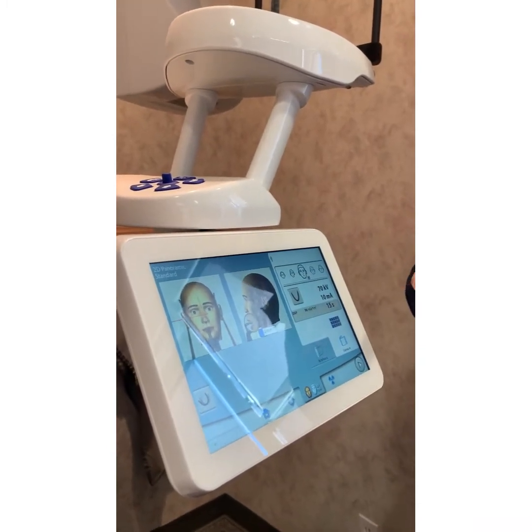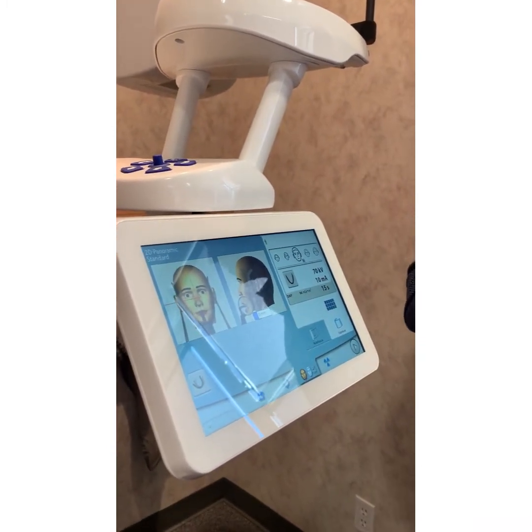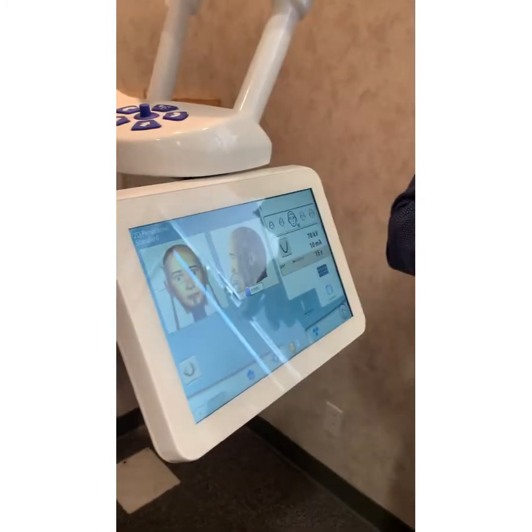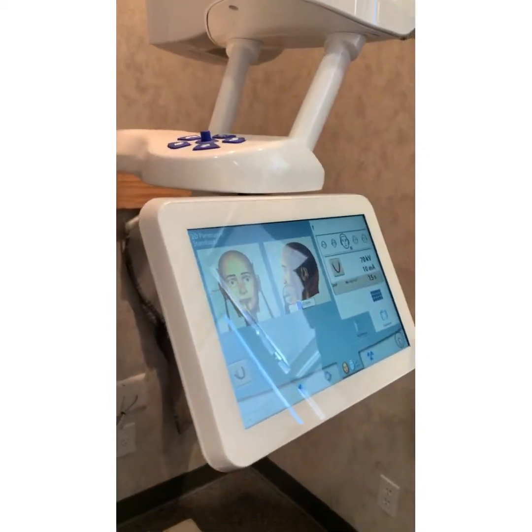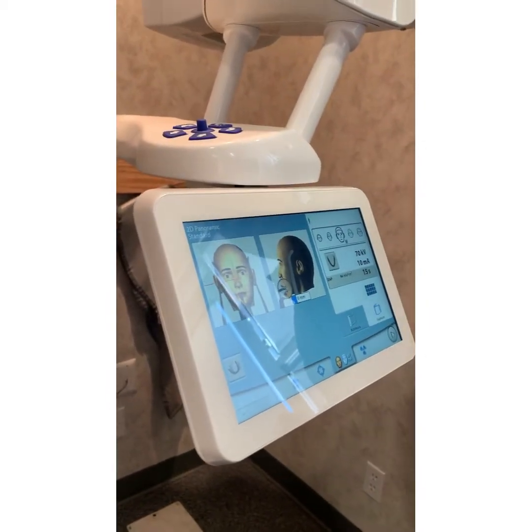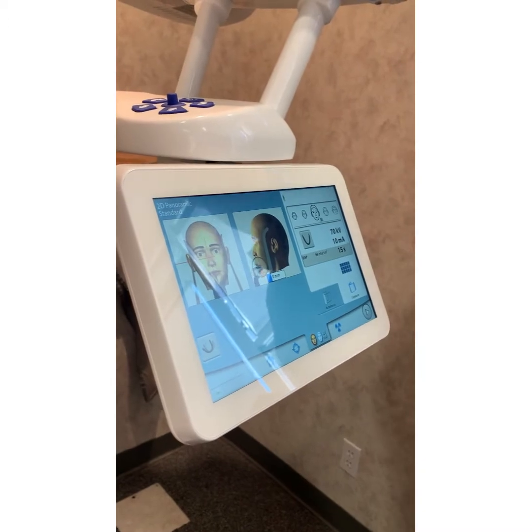Usually, if you can't nail that, and I come back and show you 3 more steps on how to use autofocus, your eyes are rolling back, double pineapples. You're lost from the first 3 steps. So I tend not to overload you with that kind of stuff. I'll email you a quick little cheat sheet on how to use that.